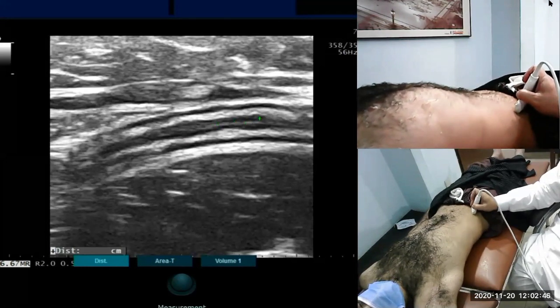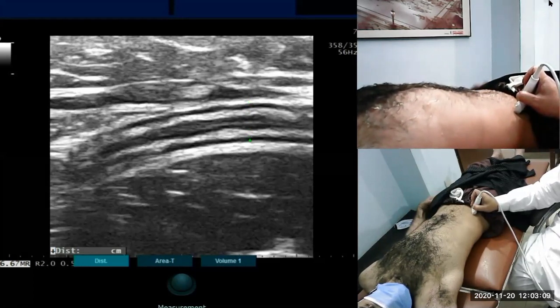The two opposing mucosal surfaces together will make this white line. On both sides is the mucosa. On either side, you see this submucosa, the white. Then is the proper muscle layer, muscularis propria, and then is the serosa, the white.